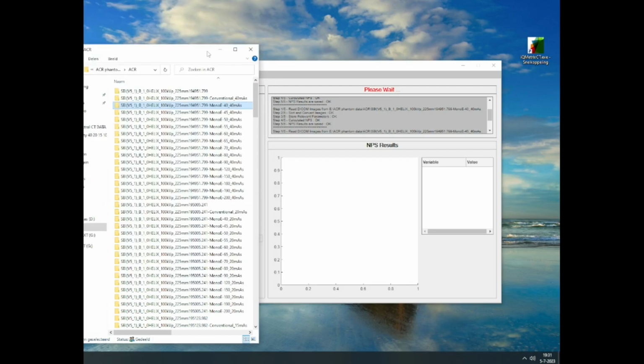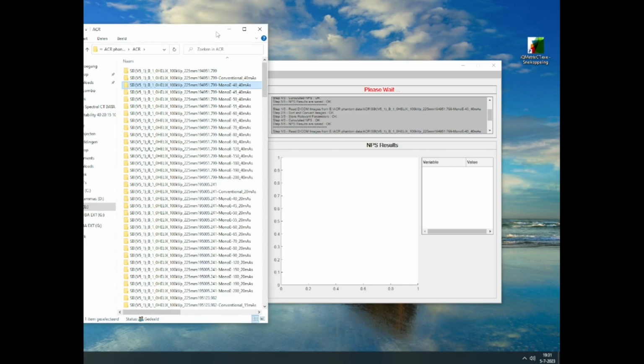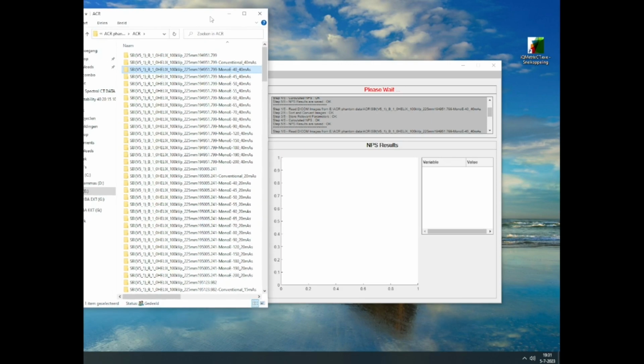And you're wondering then why is this important? Why is this happening? You need these files where you want to calculate the detectability index. Later on you will do the NPS analysis. After the NPS you will do the TTF analysis. That's also something I want to show after this. And after you have done both of these analyses, then you can run the detectability analysis, and it will be based on the individual files that are just being put in there by iQMetrix. But in addition to these individual files, you will also get a summary Excel file based on the images that you selected.